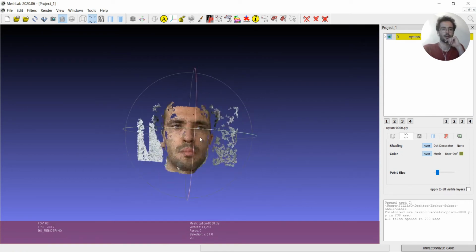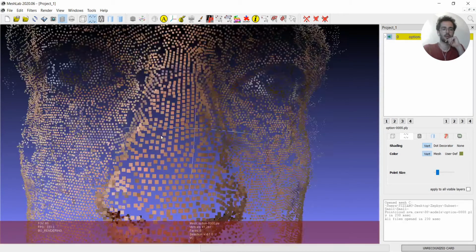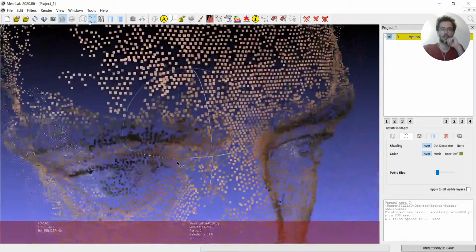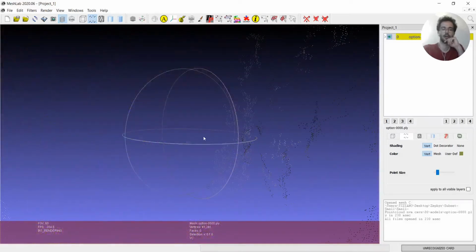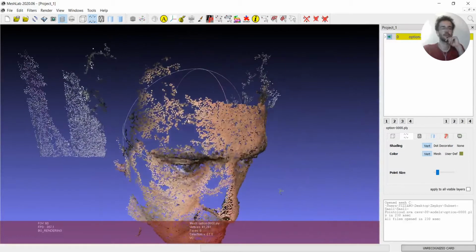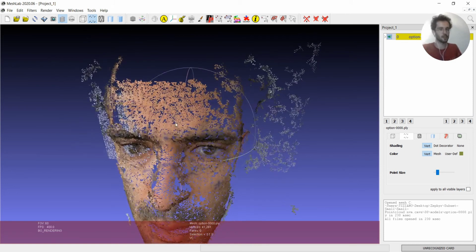So right now this seems a model, but actually it's a 3D point cloud, which is the first thing you're gonna find with every 3D scanner. The first output will always be a point cloud, except the part that you have done with Alberto, which is from the MRI scanner, which is based on pixel and voxel.